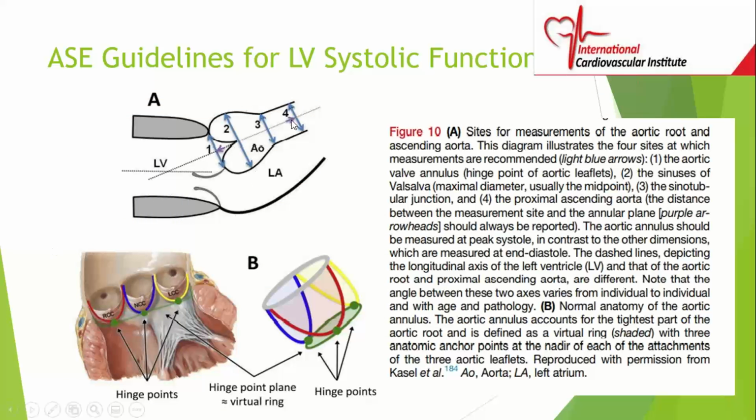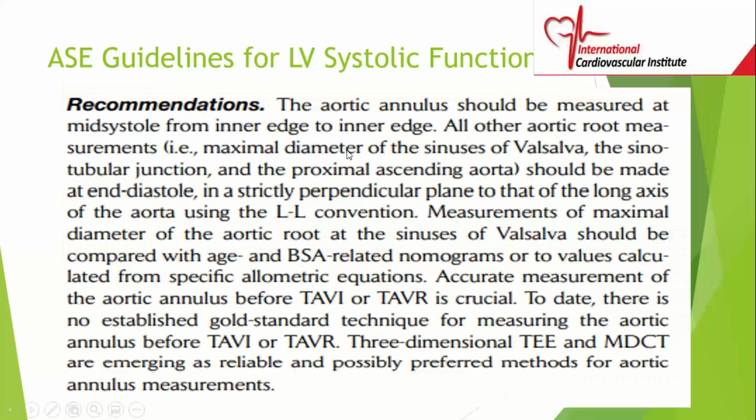So this is the long axis of the aorta, okay? So your measurements should be perpendicular to the long axis. And those are the 4 sites again, okay? So again, the annulus is from inner edge to inner edge, but all the other measures are from leading edge to leading edge, okay?